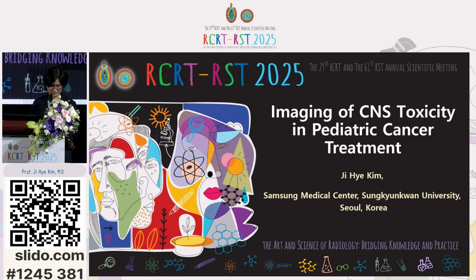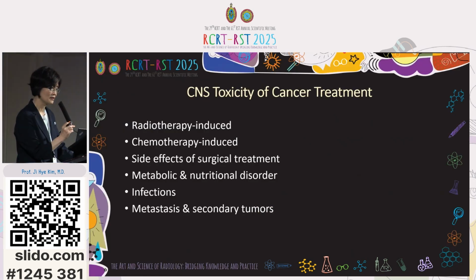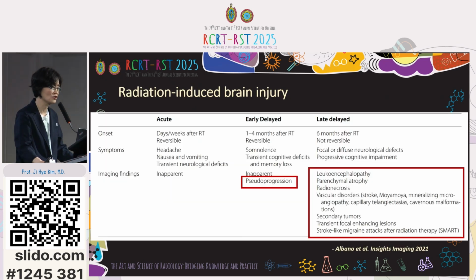Today, I'd like to review on the imaging of CNS toxicity in pediatric cancer treatment. These are the list of subjects. I will review the CNS toxicity according to the treatment options and other problems. Let's start with the radiation-induced brain injury.